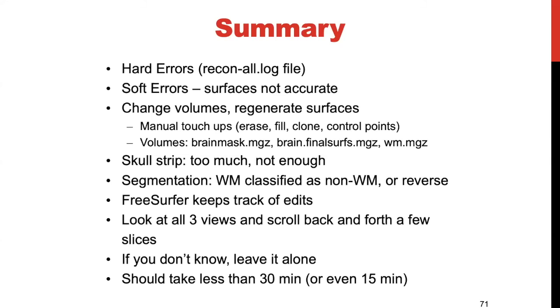Thanks, Dev. Going into detail, or just giving a general summary of the different types of soft errors: for skull stripping, watch out if too much is removed or not enough is removed for your segmentation. Keep an eye out for misclassifications of white matter or gray matter. As a side note, FreeSurfer does keep track of your edits, which is really nice for future purposes.